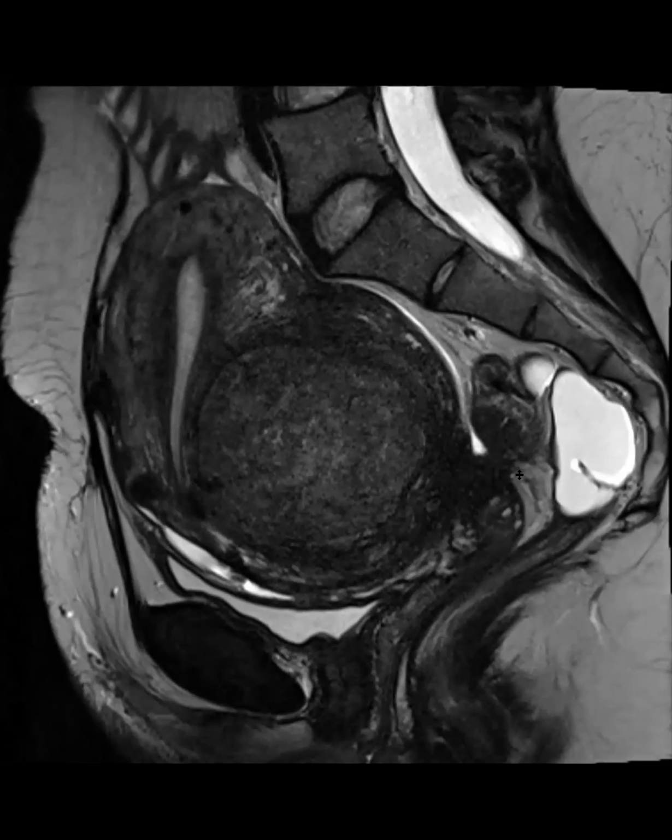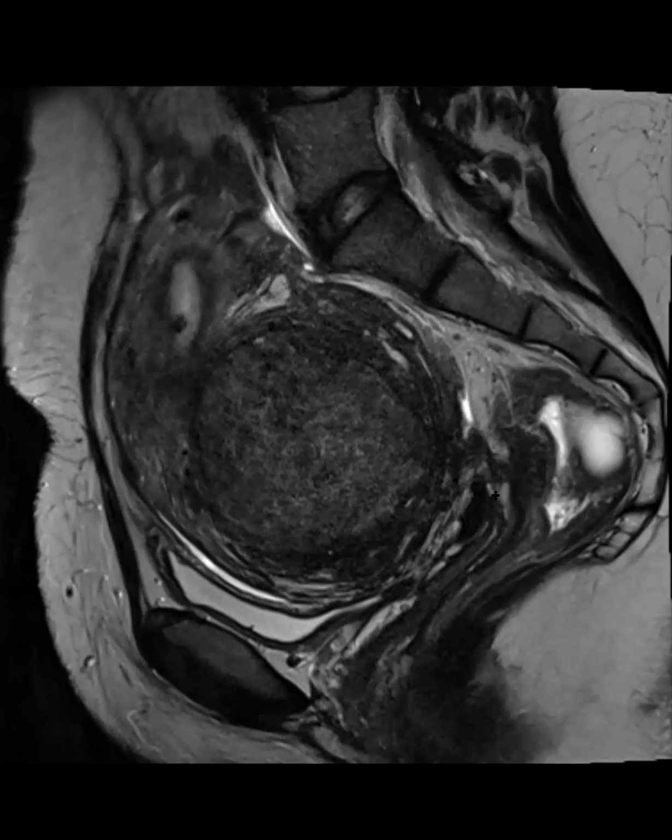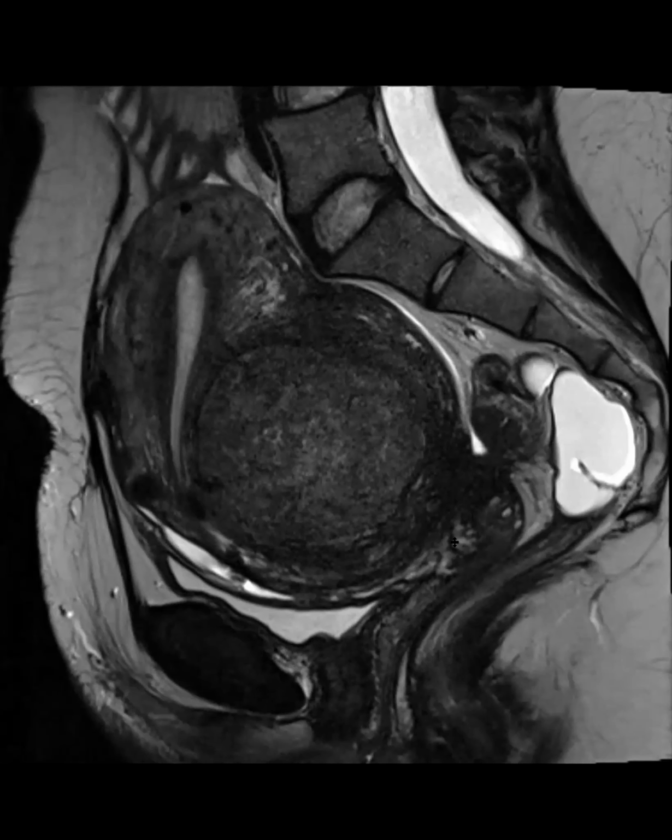So our gynecologists want to know how deep it's invading. If it's 50% or more, that changes whether they just scoop out the DIE versus do a segmental resection. They also want to know the circumference of the bowel loop that's involved. If it's greater or less than 50%, they get colorectal surgery involved because it's a more extensive procedure. So these are the pertinent things they want to know.